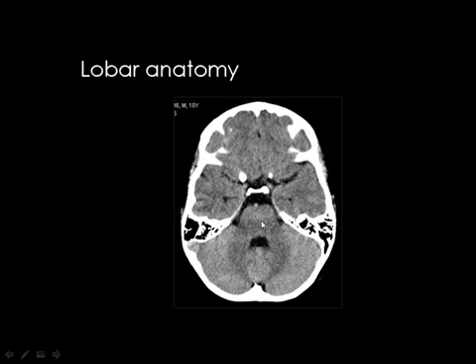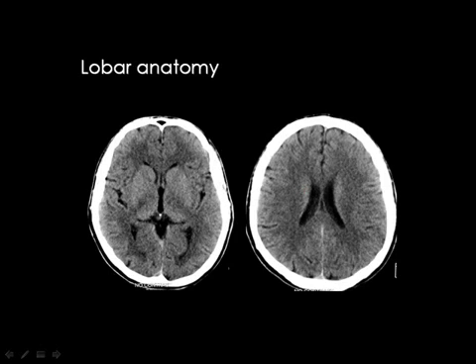If the lesion is there, what do you think? In the pons. If the lesion is here, and this is the frontal lobe of the brain, and if the lesion is here, then you are cutting in the temporal lobe. Then this is the temporal lobe, and this is the frontal lobe, and here is the brainstem, especially the pons. This is the left cerebellum, and this is the right cerebellum, and the part in the middle will represent the body of the cerebellum or the cerebellar vermis.